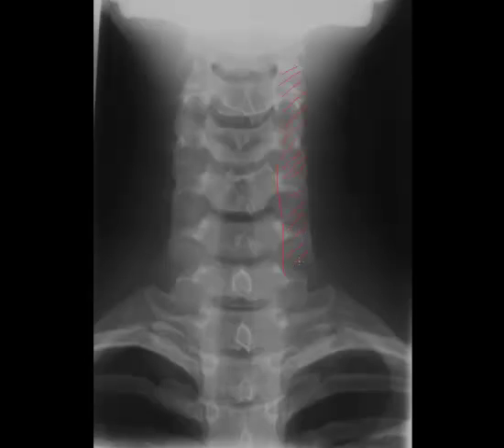Now, remember, we saw the joint space of the facets very well on the lateral projection due to their orientation. While on a frontal projection, we don't see through the joint space, and therefore these articular pillars look like one dense piece of bone. Lastly, spinous processes.